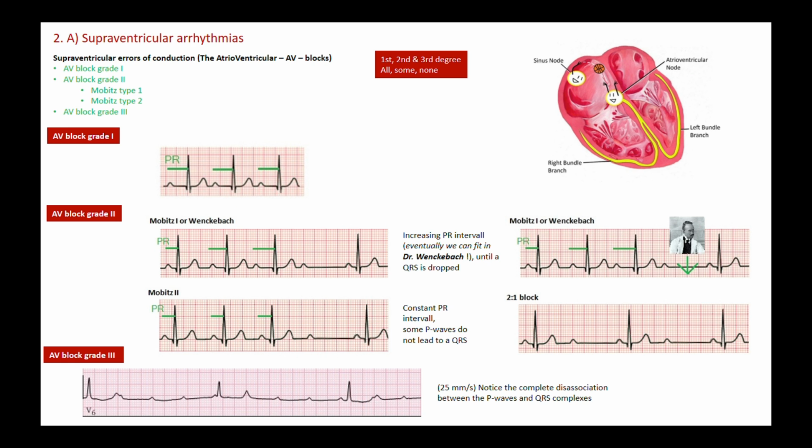Alright, so let's talk about supraventricular errors of conduction. These are not strictly determined as either tachyarrhythmia or bradyarrhythmia, but AV blocks are a well-known arrhythmia, and distinguishing between them is easy if you have a few rules on how to do it.